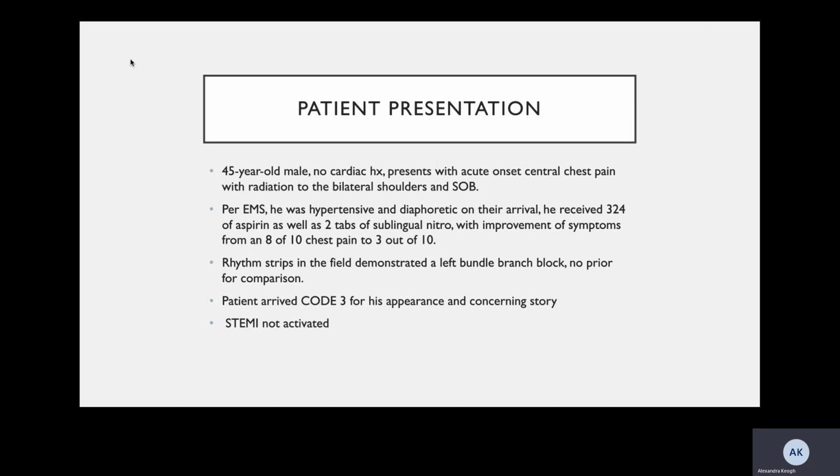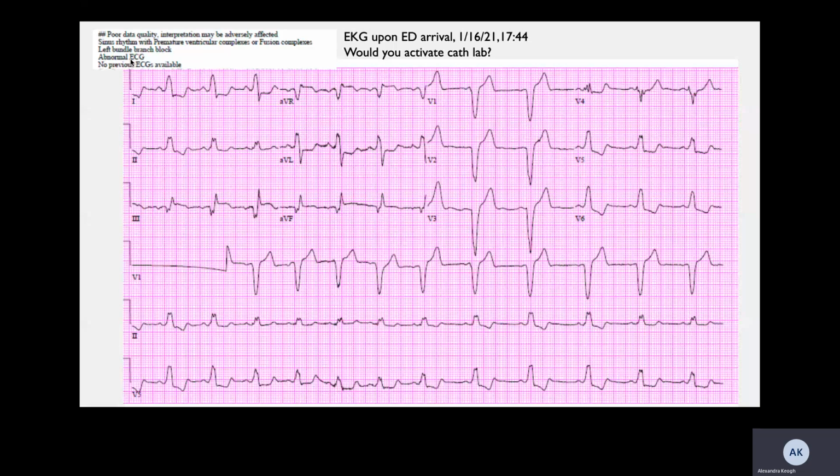He arrived code 3 to St. Vincent due to his concerning story and his appearance. A STEMI was not activated in the field. So when he arrived to St. Vincent, this was the EKG that was done upon arrival. So I'll just take a look at this EKG and see if you think you should activate the cath lab based on that EKG and the patient's story.